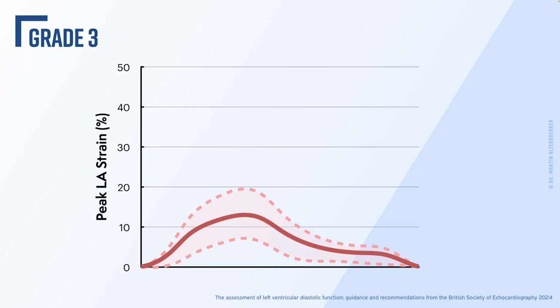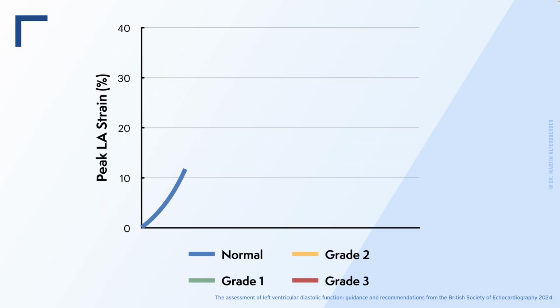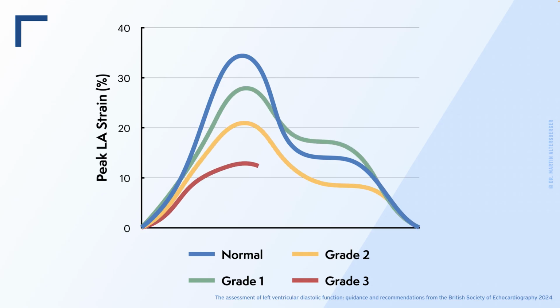So keep that in mind, how the strain curves look like when you actually evaluate patients by means of left atrial strain. Here are all the curves for you to see that you get a better overview how it should look like and how it can look like when you have a pathological situation.